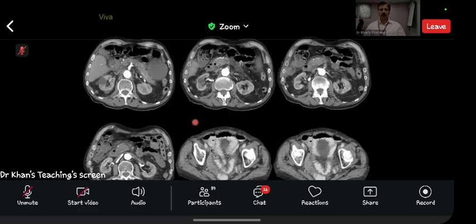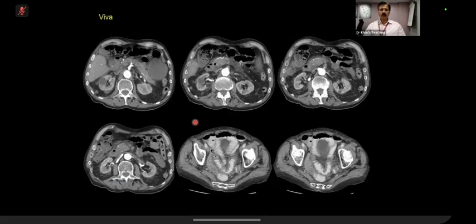will be, which is a very important exam case, there will be pertinent negatives and positives. So you have done well where you pick up if the bowel is dilated, number one, if there is thickening, if there is pneumatosis, if there is perforation, and in that category, what will be your pertinent negatives or positives? So some of them you have already pointed out. What is left now? Okay, so there's thrombus in the SMA.